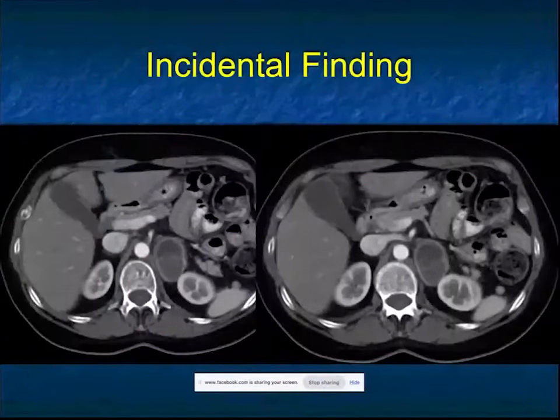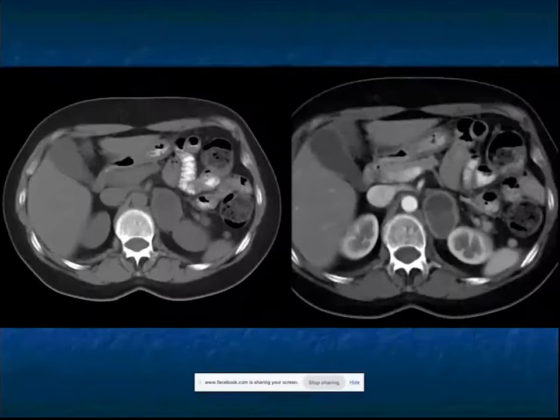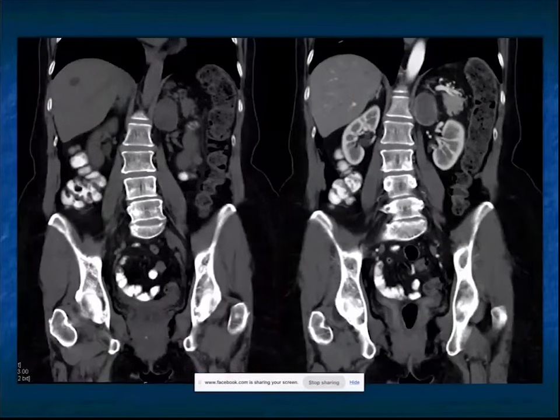Incidental finding, there's a mass by the left adrenal. Is cystic with rim enhancement. Does not have the look of an adenoma. Could it be an infarct, a prior bleed? That's a thought. Could it be an adrenal cortical carcinoma? They can be cystic. Could it be pheochromocytoma? That can be cystic as well. It's kind of unusual to look at non-contrast. Contrast, you see the cystic lesion, you see the cystic component, and you see the rim a lot better on the vascular part.